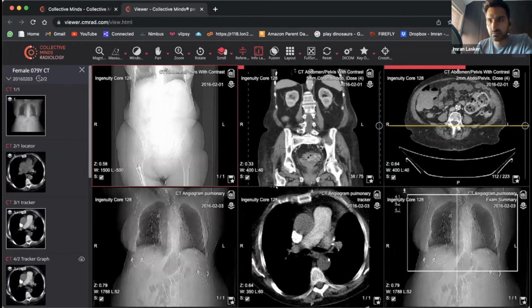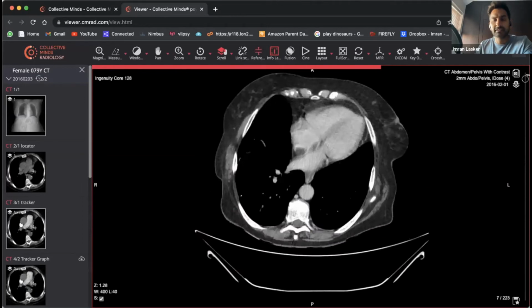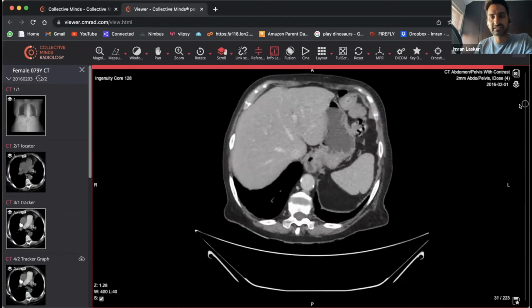Okay, so we are now looking at, let's do this one. Go from the top. So again, it's abdominal pain. Let's think about what phase of image this is. Okay, so we're coming down, we've got a small hiatal hernia. Yeah, a bit of hiatal hernia, but probably not causing abdominal pain. It doesn't look like it's compromised in any way. And most of the stomach is actually sitting below it.